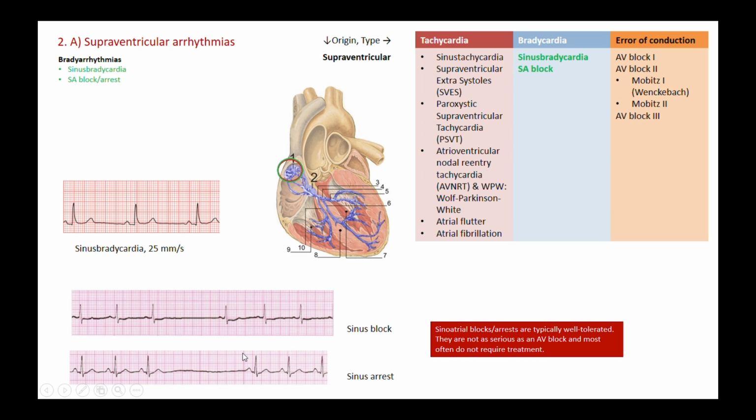Normally you have to do some electrophysiological studies, and this is in the realm of a specialist, like a cardiologist, and a little bit outside of what we're going to be discussing here. But if you see such a break, and otherwise a normal sinus rhythm in between, as long as this is just once in a while, it is not of any major concern.